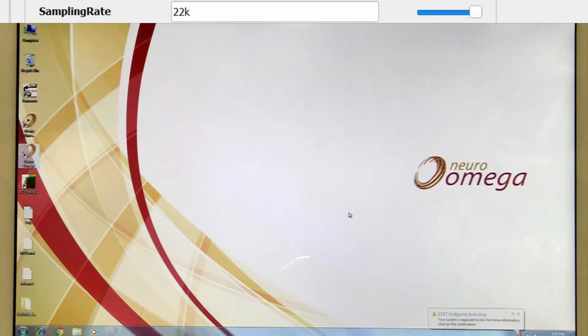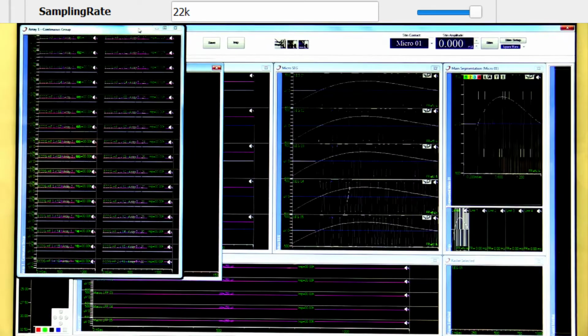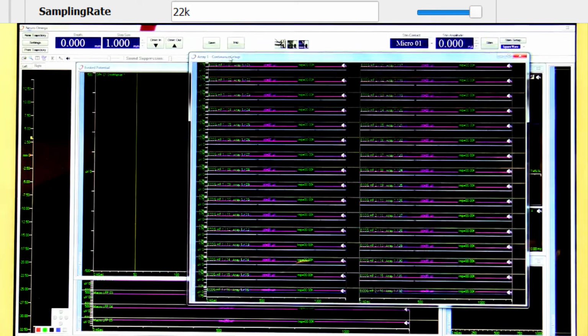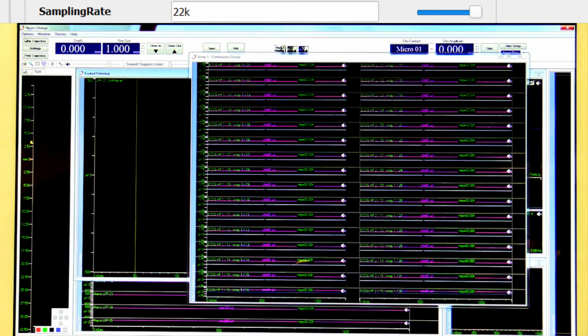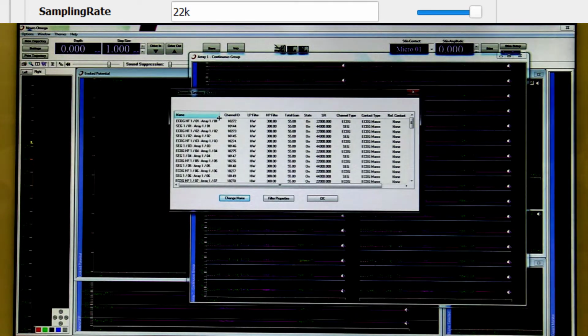Once you start the operation, you can press Ctrl-Shift-M to view the options bar. Go to the channels you want to sample and make sure they are viewable with the correct sampling rate. If it is empty, it means they aren't being recorded. Make the sampling rate parameter in BCI2000 match what is specified here.